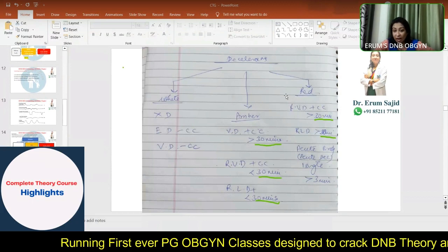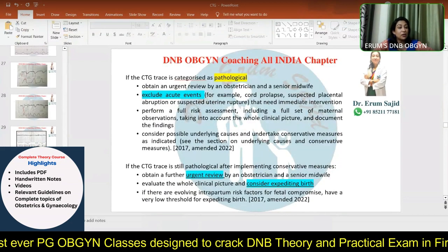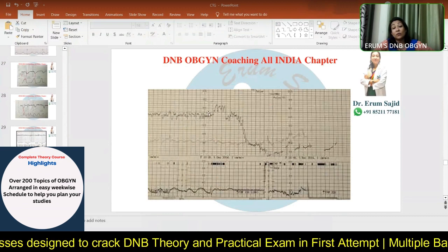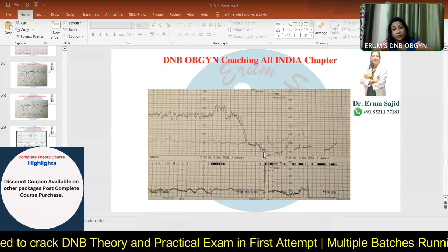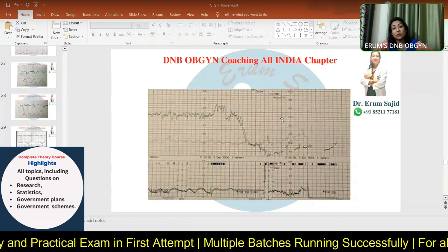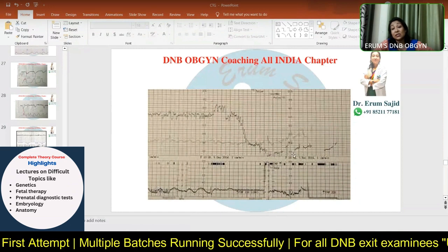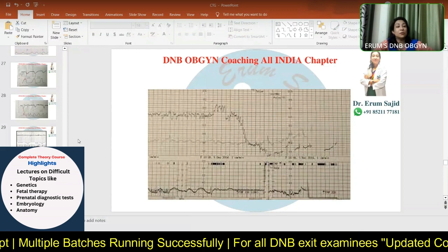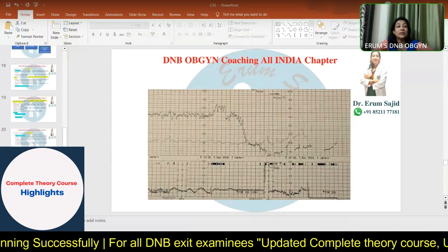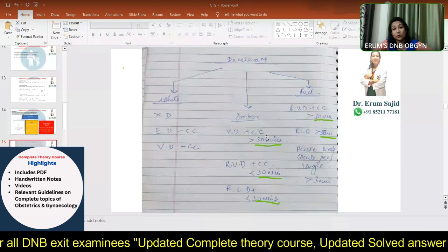I have a slide to show you this acute bradycardia episode. I'm sure many of you have already been through a traumatic experience like this. It was fine up till now, it was even having an acceleration. Suddenly it takes a dip, and it's not coming back. This particular part is 1 minute. It will start going down, again for 1 minute, and it's still staying on. So you wait for 3 minutes before clubbing it as red, ominous, pathological, whatever, and start taking a step forward. And then I'll tell you the steps. You'll be very amused to see the steps also.